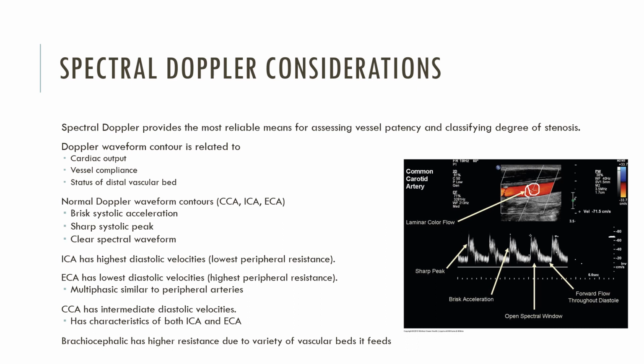Now, if this technologist had opened up their gate to include all the vessel, or even beyond the vessel, they would see a much broader range of velocities produced at that one moment. Maybe those blood cells having friction against the vessel wall would be going nearly 0. You'd see that line much longer, from 75 or 80 all the way to 0. If we had many of those large sample readings together, you start to see what we call spectral broadening, or a closure of that window.